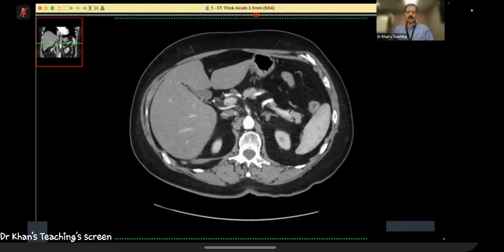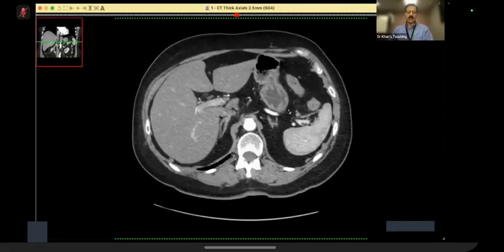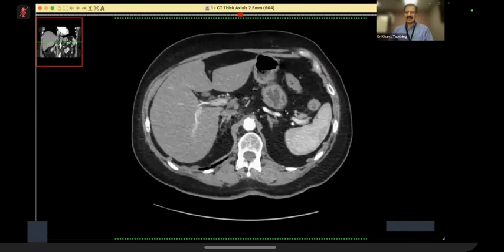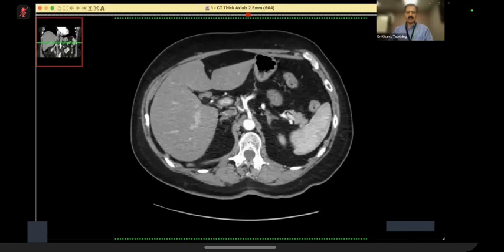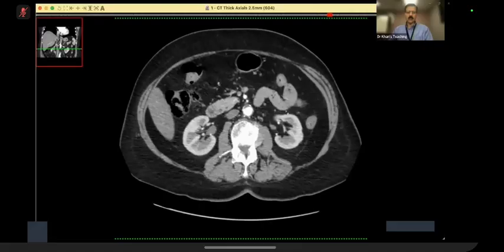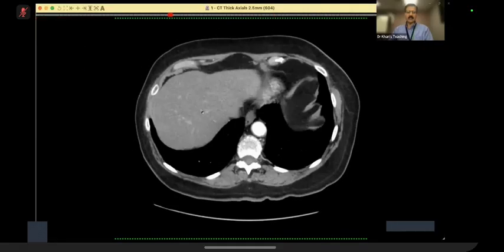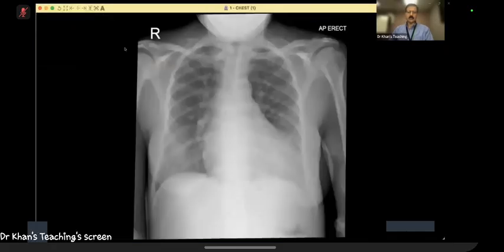Then I want to rule out any multiple lesions, and I'm looking for that. Then go for metastasis. In the exam case, there might be metastasis. I warn you, because these can be malignant and there might be metastasis in the liver. Okay, next, please. Over to you.